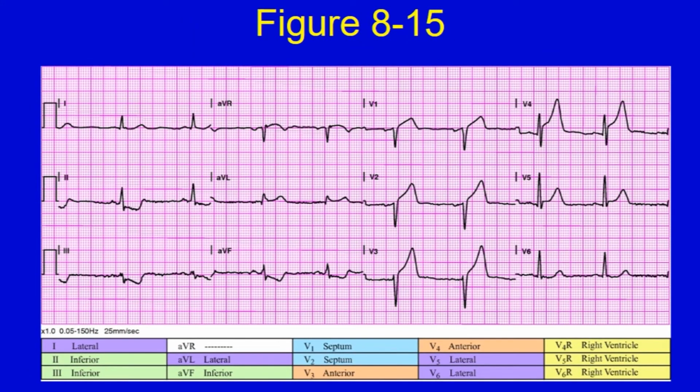This is why we're doing rate and rhythm. And they're a little bradycardic. Don't miss the bradycardia. Patients die with us looking at 12 leads, okay? Don't let them die reading the 12 lead. Not that that's necessarily knocking them down, but that may tell us part of what's going on with them. Yeah, they actually say 53, but I'm with you on the counting.